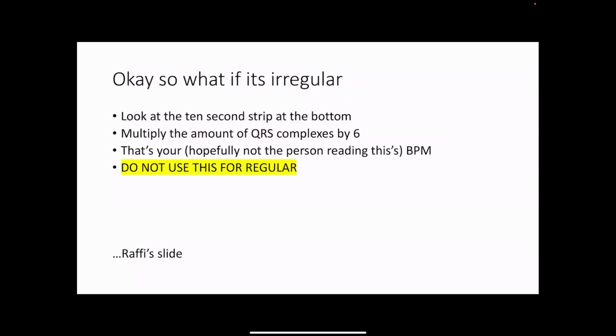Now, let's say that you get an ECG and it's irregular. How do you find the heart rate?